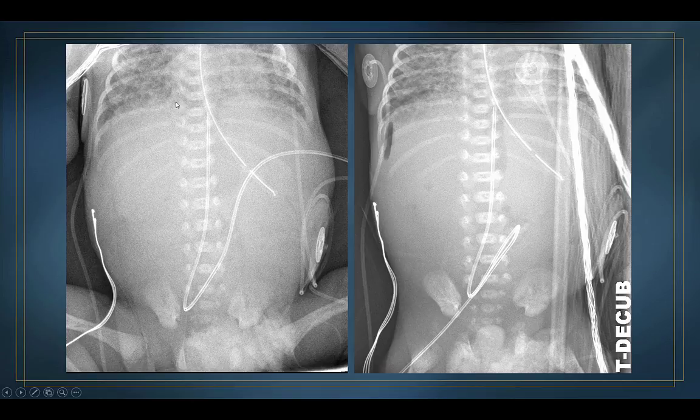And just to show you, even though there's not a lot of bowel, there's really very little bowel gas in the abdomen. On the decube, there's definitely a pneumoperitoneum, and I defy you to tell me where that lucency is on this radiograph. It happens to be sort of a crummy, grainy, supine view of the abdomen, but this is, again, the reason why you have to do a decubitus film every time.